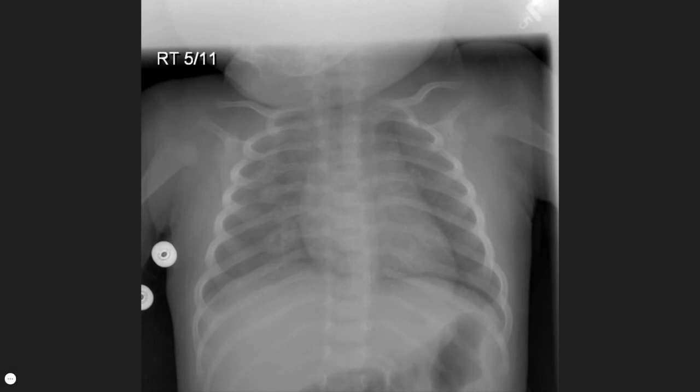This image shows the importance of checking the bones. There are multiple bilateral posterior rib fractures in a linear pattern with variable degrees of callus formation suggestive of varying age. This kind of appearance is almost invariably associated with non-accidental injury, typically when an adult grabs a child by the chest and squeezes.